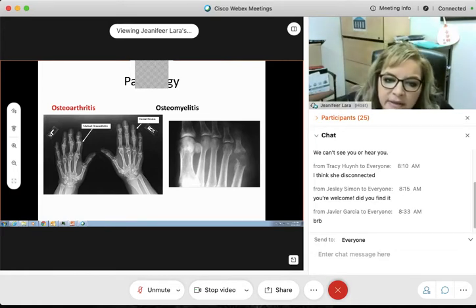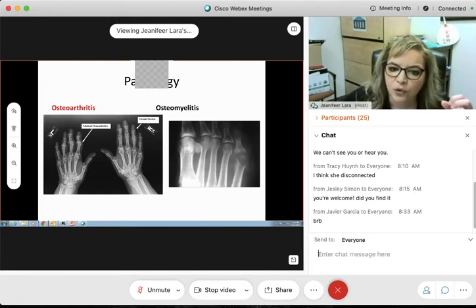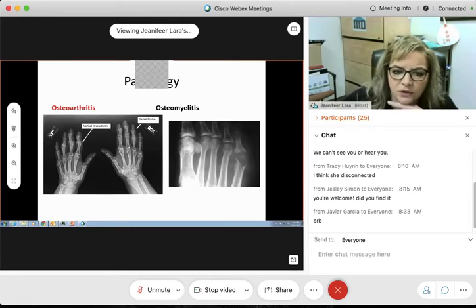These joint spaces don't have a lot of space, but look at the outline of the metacarpals and the bases of the proximal phalanges. They're pretty sharp. You can see the cortical, the hard bone, and the soft bone.